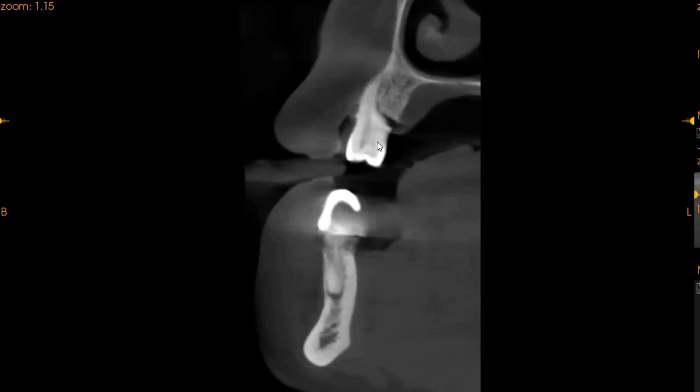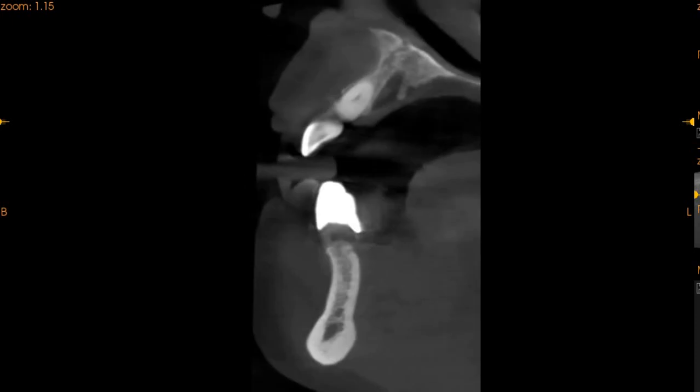There we go. So this is where you can see taurodontism, and you can also see calculus formation here, and you can see a little bit of a longer root and a dilacerated root in the upper right, second, first premolar. When we move to the upper left, the lateral incisor is again significantly cavitated with periapical radiolucency.